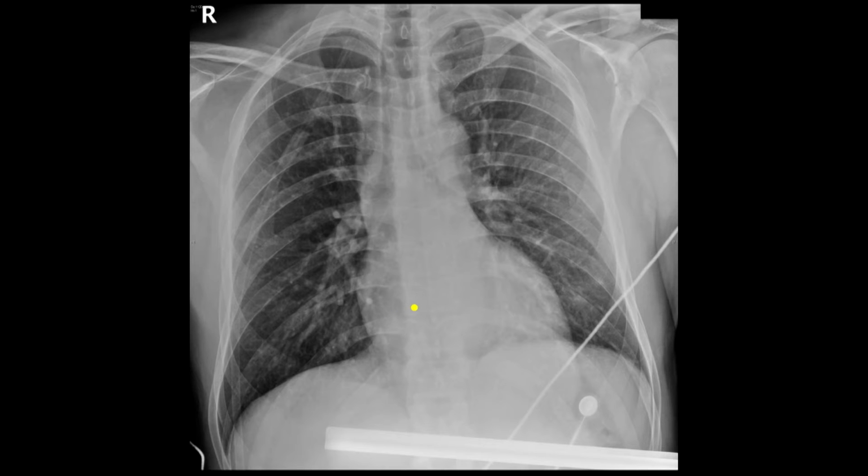So this patient, we're predominantly concentrating on the bones, and if we look superiorly, you can see that the patient has a comminuted fracture, complex fracture of the mid-clavicle. Anytime you see a fracture of the clavicle, you always want to look carefully at the shoulder, and you can also see here that there's an irregular lucent line going through the scapula, so that's concerning for a scapular fracture.